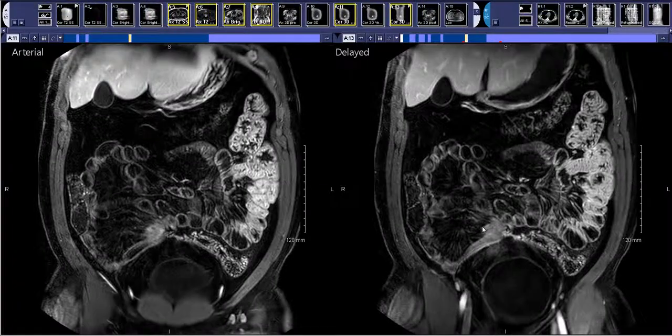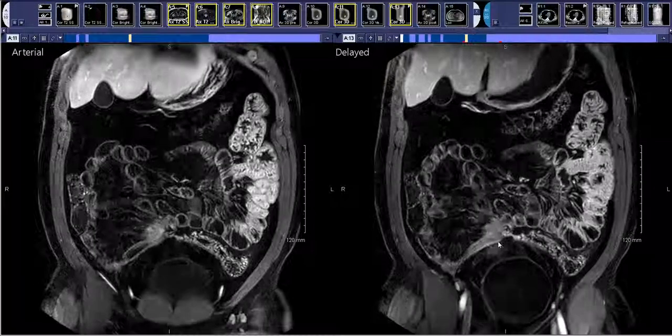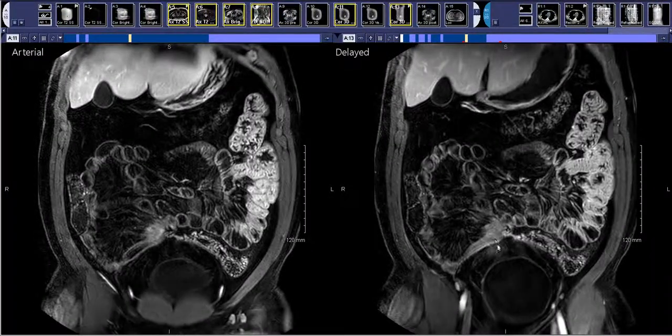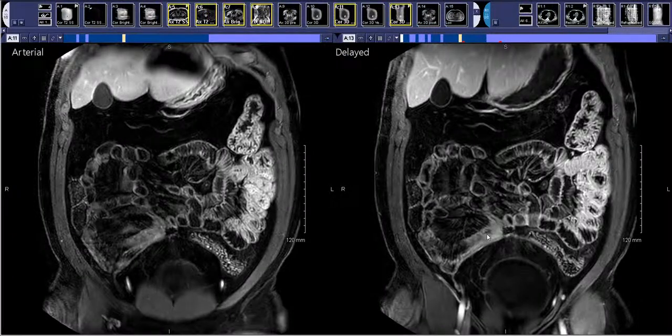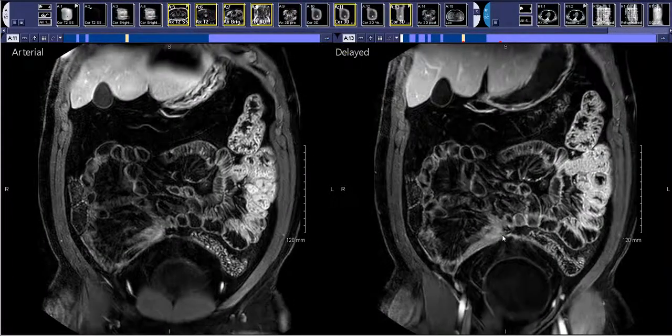We also want to look for a phlegmon, which is an ill-defined inflammatory mass, or an abscess, which is a well-circumscribed, peripherally enhancing fluid collection. Usually those are found in areas which have considerable luminal narrowing and active inflammation, such as this.